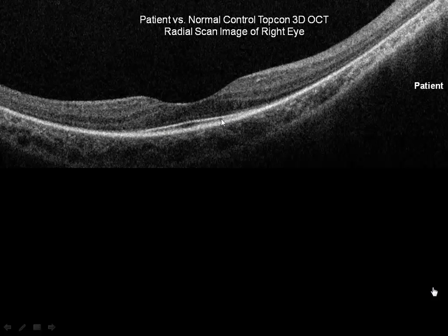Now that's interesting because if we go back to the Osterberg curve, this is where the cones are, the highest concentration of cones, and there are very few cones outside of this area. So then we go into a zone where we have pretty much entirely rods, mostly rods. So this patient looks like the cones are intact, and the patient does have 20/20 acuity and normal color vision, but the rods seem to be missing. What might you think this patient has? Well, there's the PIL. It sort of ends where we've shown it.